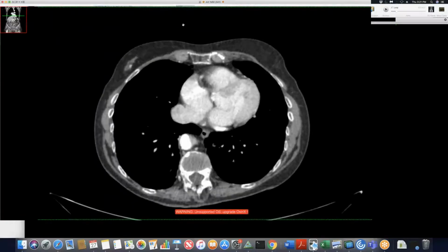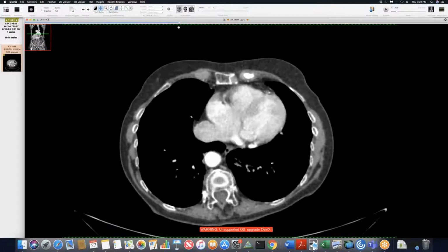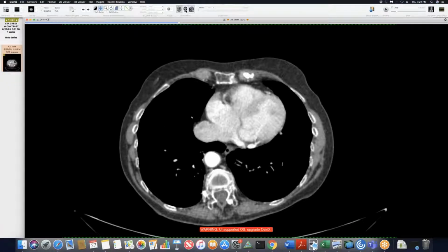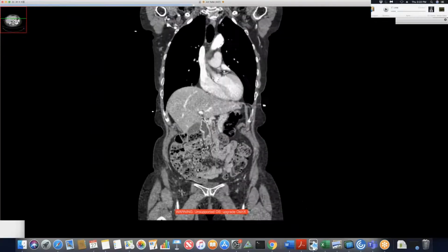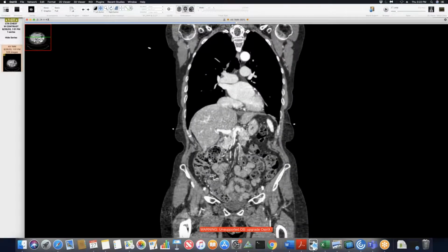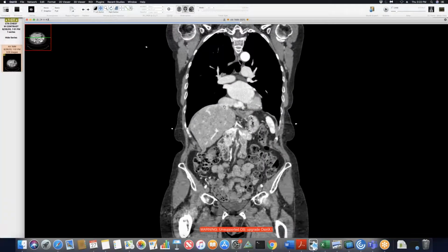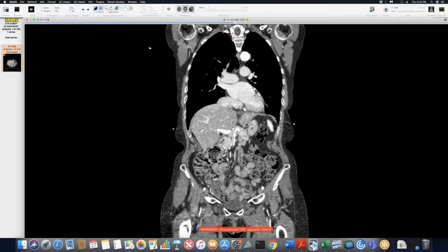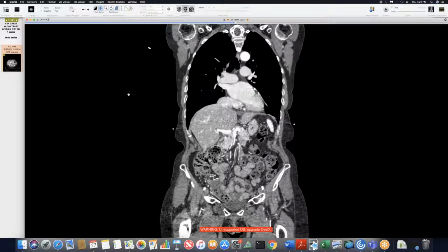Yeah, can you show it again? Because I don't think I've ever recognized that before. I've never seen that before either. I was wondering if anybody had, but right there, and I can show it on the coronal also. So it seems like this is the vein, the IVC, and then there's another vein here that's anomalous, that's also draining, and causes this dilatation of that structure there.